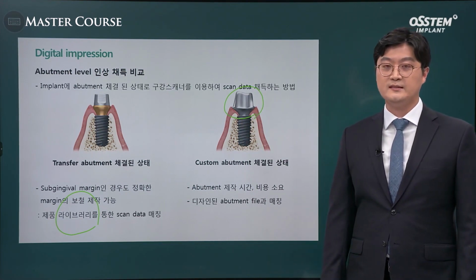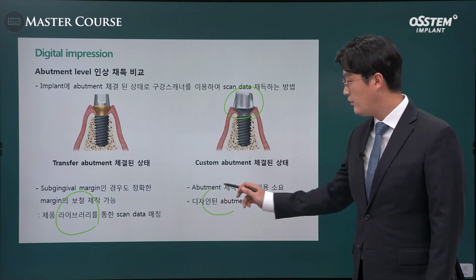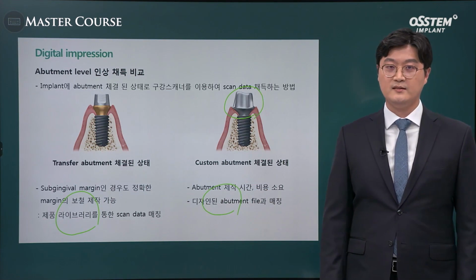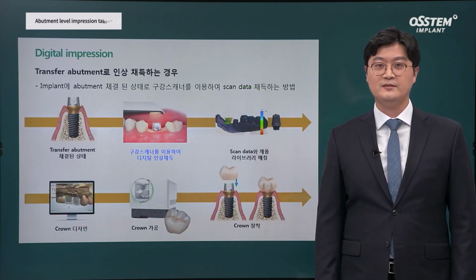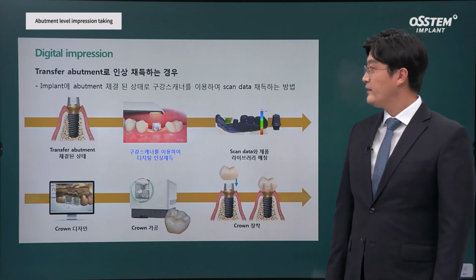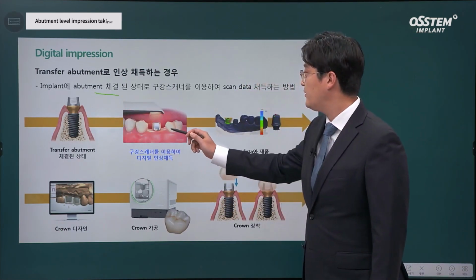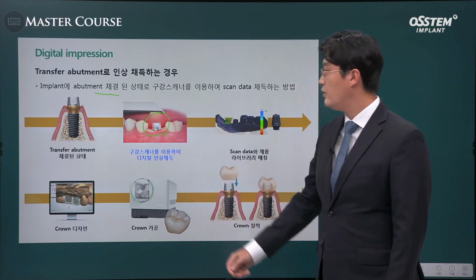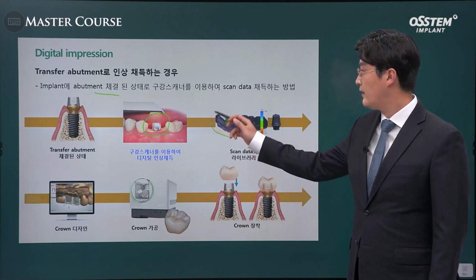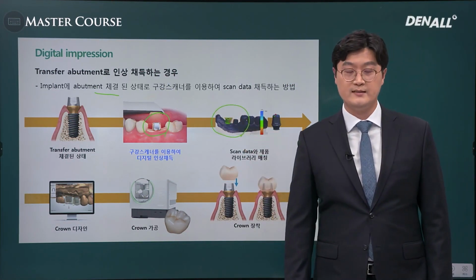Whether they are made by a lab or in a dental clinic, the design abutment file would exist so they can be matched with the product library. Digital: a stock abutment is connected to an implant, and after it is scanned using an intraoral scanner in a CAD program, it is matched with the library.